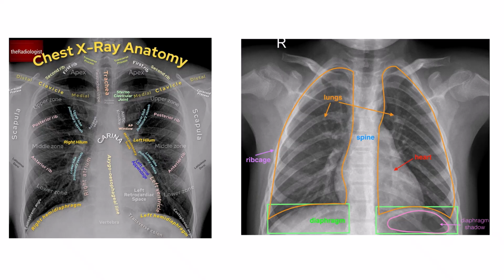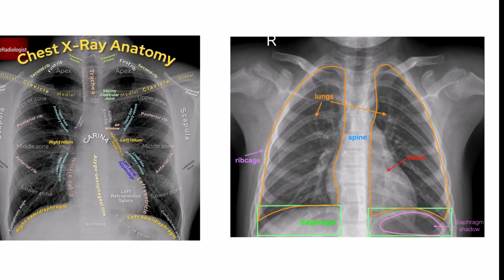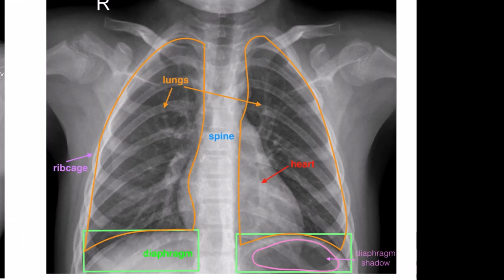In trauma chest imaging, once the radiographer confirms the image is diagnostic, meaning it's properly exposed, centered, and includes all the critical anatomy, their analysis shifts to a structured sequential scan of key regions. This isn't about interpreting every subtle detail, but ensuring nothing crucial is missing. Radiographer's sequential image quality scan post-diagnostic check.